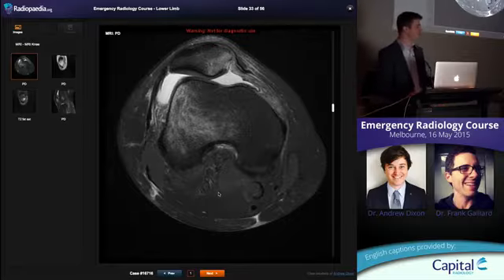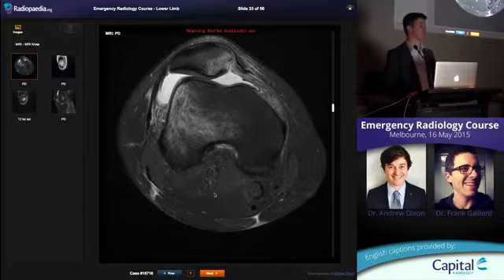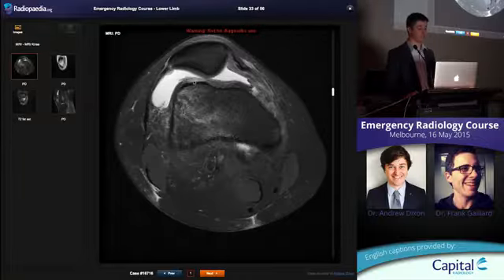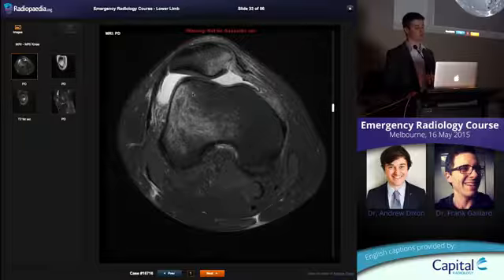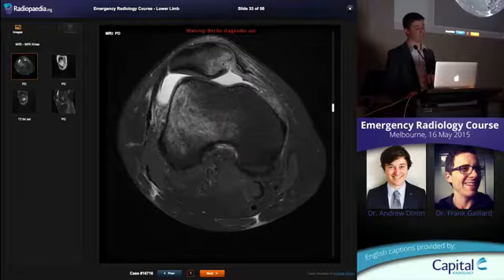If you have a patient who presents with an injury to their knee, often they don't know they dislocated because it just transiently comes out and then goes back in. So if you have someone who you think has had an injury to their knee, you do an x-ray, they've got a bit of a joint effusion, but I can't see a fracture, one thing to think about is, have they had a transient patellar dislocation? And if so, do I need to look into that further with an MRI? On MRI, you're going to see this classic, what we call kissing contusions. Okay. Marrow edema here in the medial aspect of the patella, corresponding with this contusion, marrow edema on the lateral femoral condyle. So this patella came across, clunked onto the lateral femoral condyle.